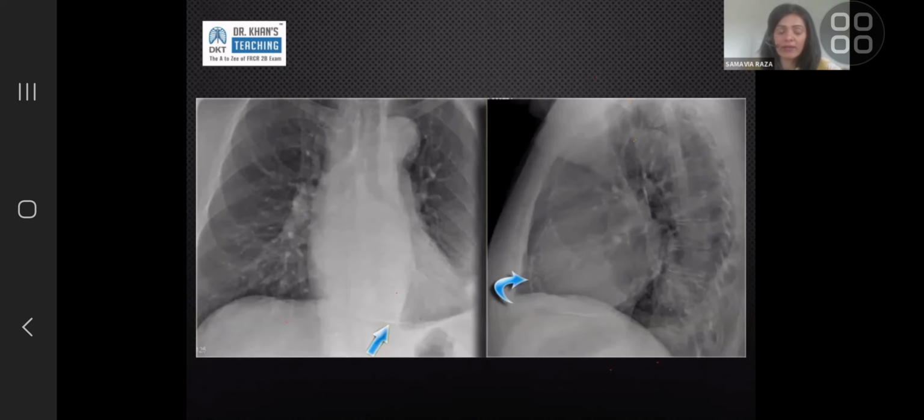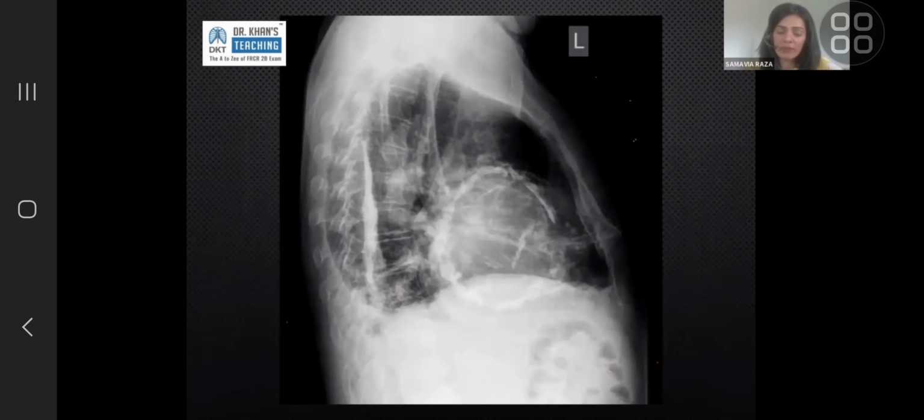The patient would be asymptomatic. You can see it post-trauma, post-pericarditis, depending on which part of the world you're in, post-TB, post-viral infections even. So if it's thin and curvilinear, you should be able to perceive it in a good quality film. In a bad quality film, you can miss it. But in an asymptomatic patient, it doesn't really need further workup or investigation. When it's quite prominent, when it's dense and chunky, the likelihood of that being asymptomatic is quite low.